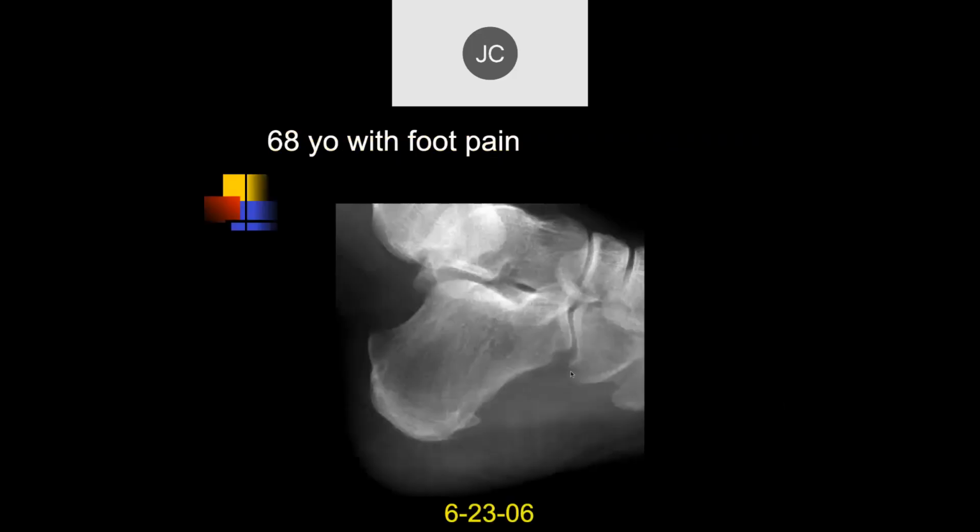So just because you see calcium doesn't mean that the patient has pain. That's old stuff right there. Right. That's all chronic disease. I can personally vouch for that. All right, so this lateral heel radiograph, there's a small plantar calcaneal spur.